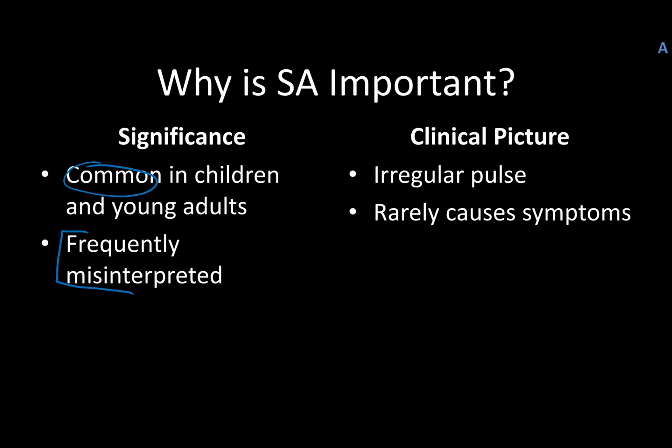In fact, I remember the first time that I saw this and I had no idea what to call it because they were actually bouncing between tachycardia and a normal heart rate, and I didn't know what to do. So I share this with everyone just so that you can have an idea of, hey, this exists, and if you encounter this situation, this is what you call it. And it actually makes it fun when you do find one.